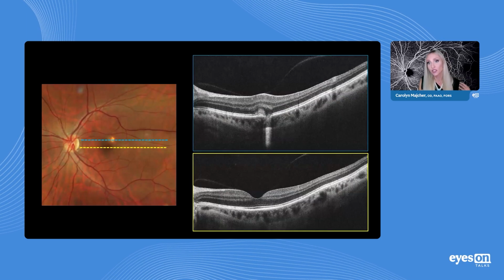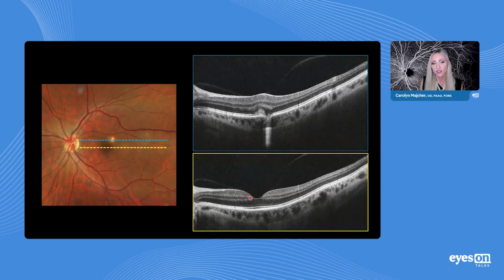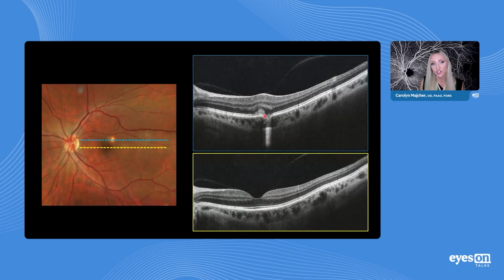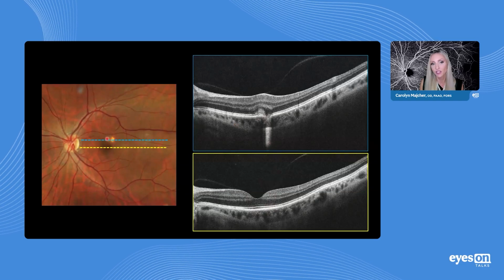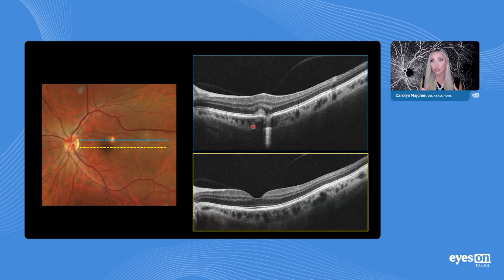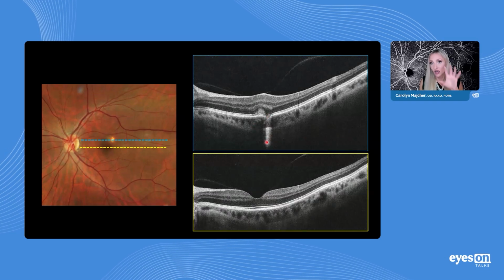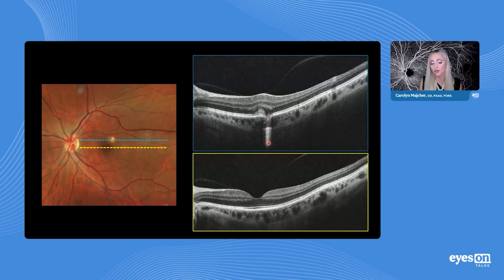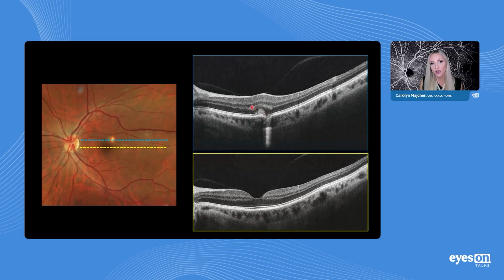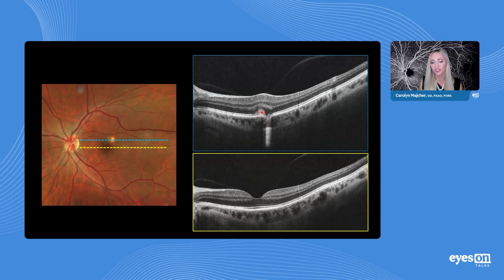I took some structural OCT raster scans through this particular lesion as well as the center of the fovea. You can see the center of the fovea looks good, it's unaffected. But when we look at the region of this hypopigmented circle, there appears to be a disruption in the RPE-Bruch's membrane complex that's allowing some light transmission to come down through the choroid, so choroidal hypertransmission. And adjacent to that area of disruption, there's some subretinal hyperreflective material or kind of fuzziness.